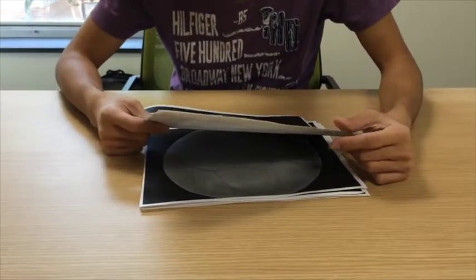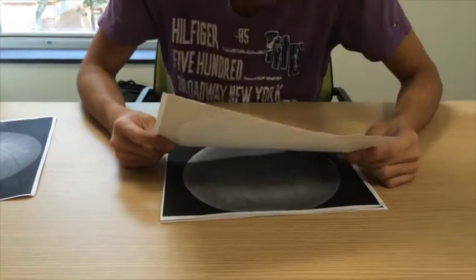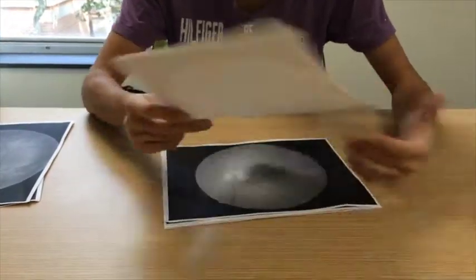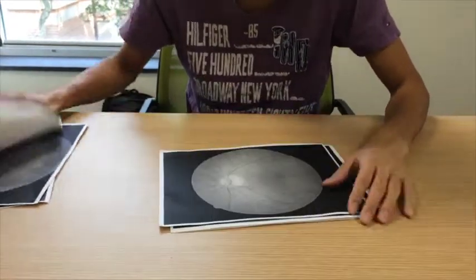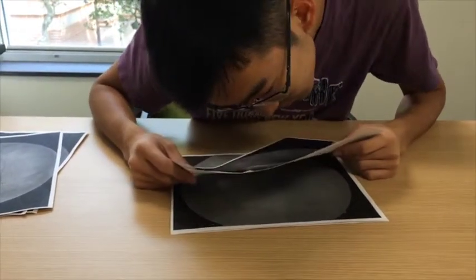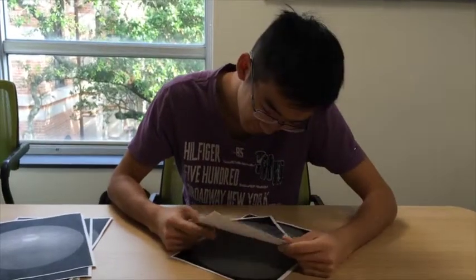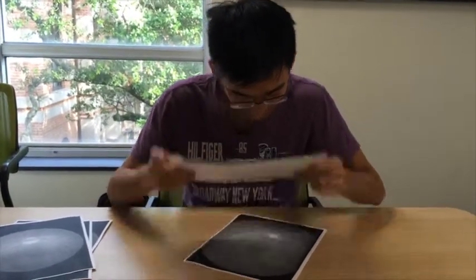However, the detection process is completely manual and time-consuming. It requires a trained doctor, clinician, and technician to take the image and examine it for many symptoms. This process of review and examination takes up to a few minutes to hours depending upon the severity and condition of the disease and the number of images or patients seen at one time.